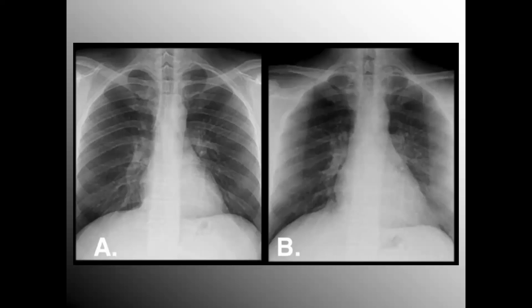Here we have a chest X-ray of the same patient. On the left, the cardiac silhouette is a bit more defined. If you notice, it's discrete, but I want you to center in on what I'm trying to really get across here. You see, it is a much clearer picture if you look at it in great detail than over here. And you say, well, these were shot hours apart. It's not true. I'm telling you, shot on the same patient within the same few minutes. You'll also notice in picture B this straight line on each side that does not show up in picture A. Same patient, same time frame.